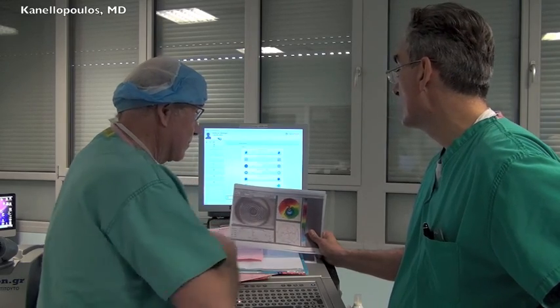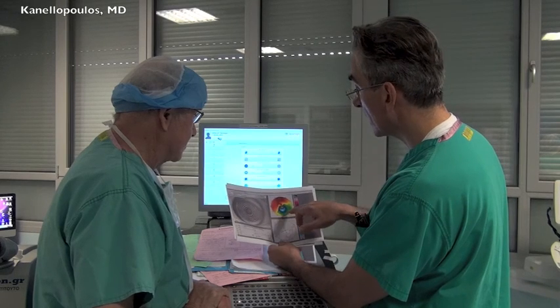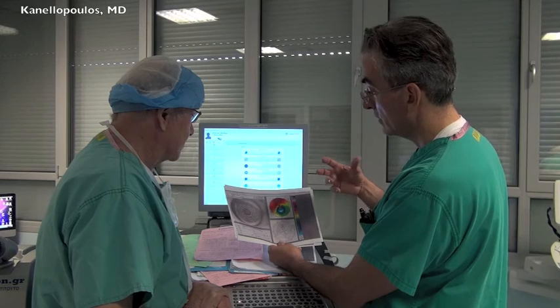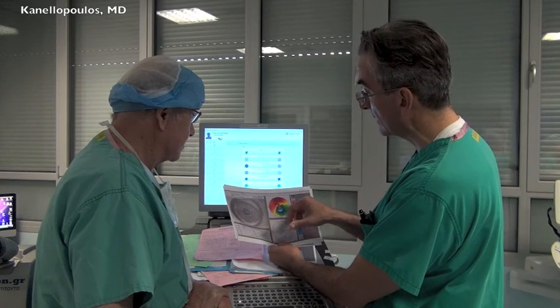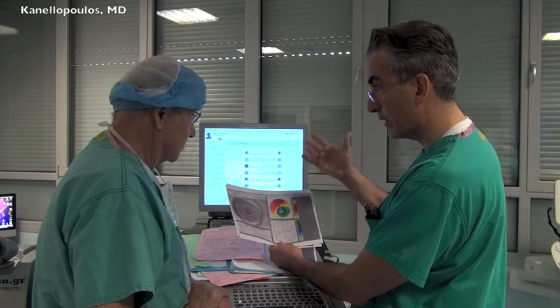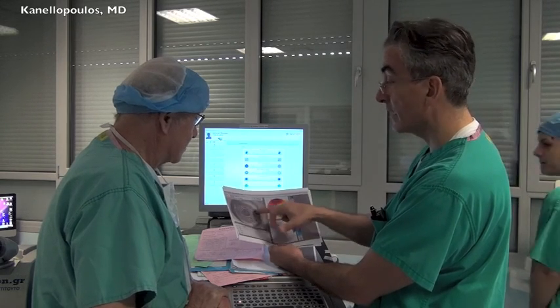How can that happen? Well, it's extrapolating the numbers, but it's giving us dotted lines where the data are not directly raw data translated to topography. So we kind of have an idea which part of the cornea is imaged and which part is extrapolated based on the available data. So the available data is just this.